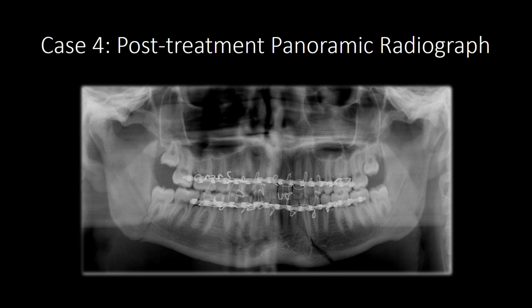On all post-operative radiographs for mandibular fractures, it is very important to note the position of the condyles. They should be fully seated within the fossae bilaterally. Because remember, this patient will be wired shut for 6 weeks to allow for healing. If the condyles heal in an abnormal position, this patient would need an open surgery to re-break the jaw and re-establish normal occlusion with the condyle in the right position. So really important to note the position of the condyles on post-operative panoramic radiographs.